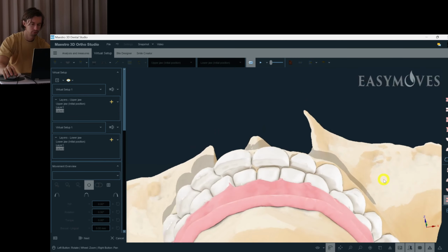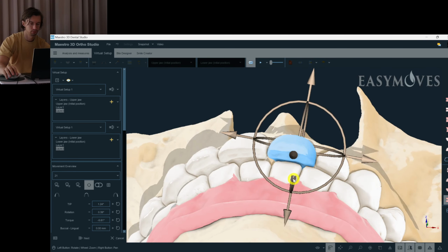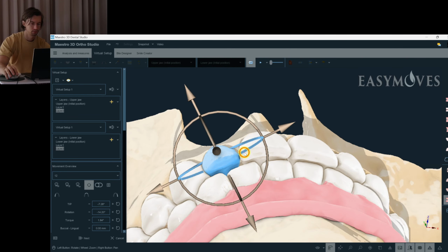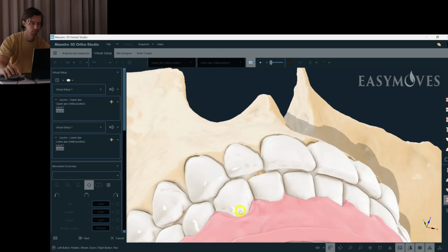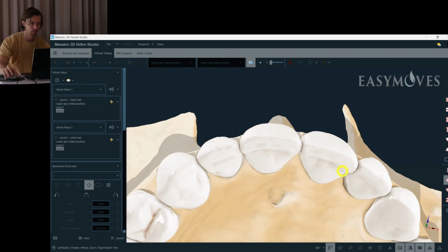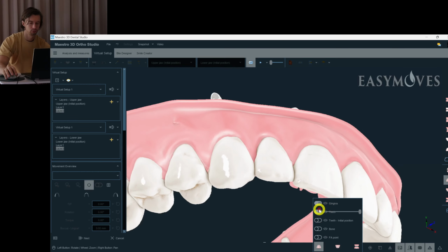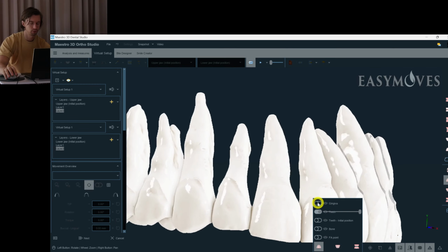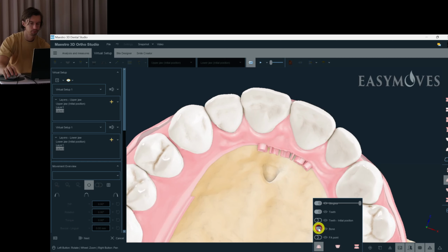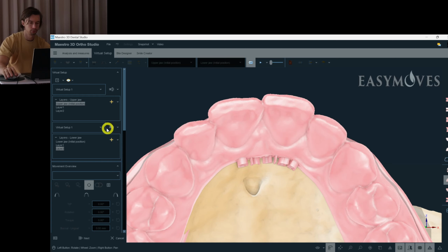And we should keep the incisors more palatally. Good contacts between the canines, I like it. Hope the extrusion will work. The root is not super long, so it's doable. Now we're checking the overcorrection on the upper jaw.